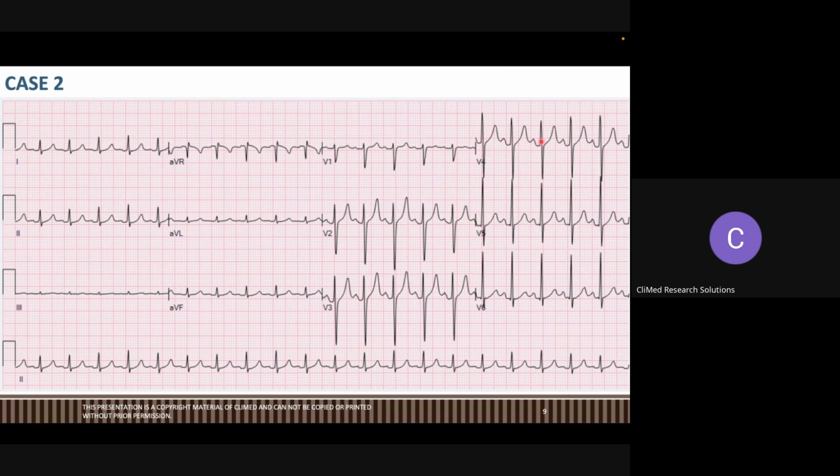See, this, this. Look at this. This also. Similar straight line. Okay. Count the HR. It is consistent. See, 2.5, somewhere around 140, 150. Here, around 150. Here also, around 150. See, around 150. Yes, it is around 150, 160. Here also, 150. There is no irregularity. If you're checking one or two small boxes and you tell me there is inconsistency, not at all.